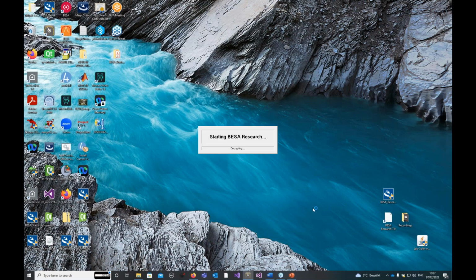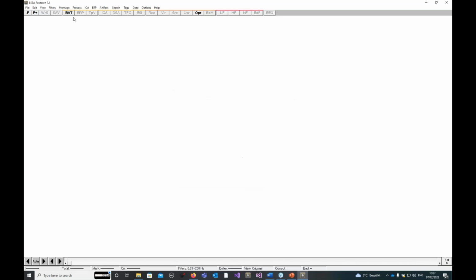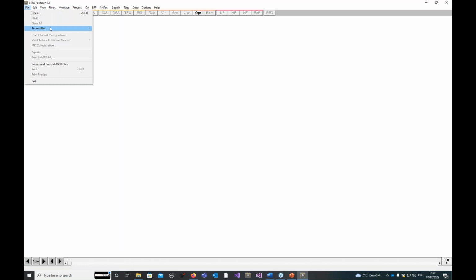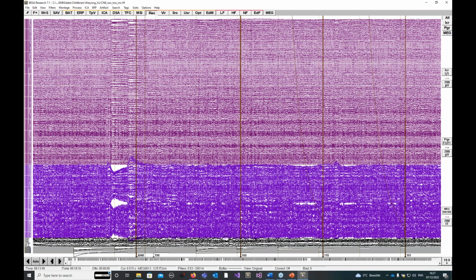So let me start my BESA Research first to get access to the data. This data I want to show you is from an experiment that we did in a collaboration in the ChildBrain project. There was an audio-visual stimulation.